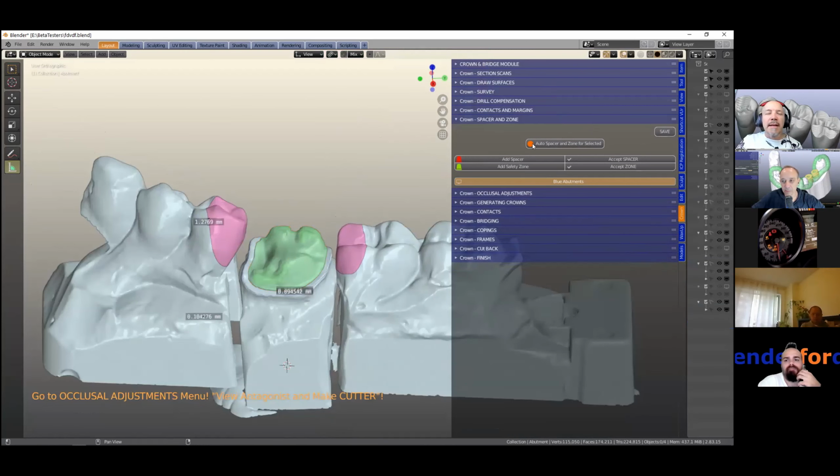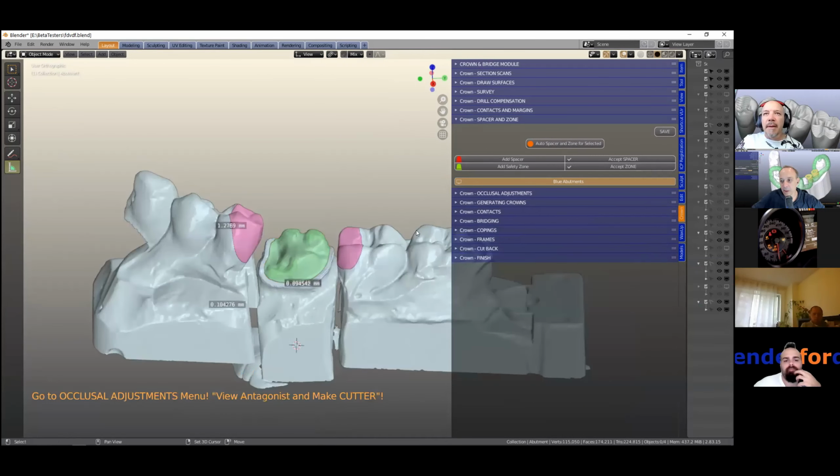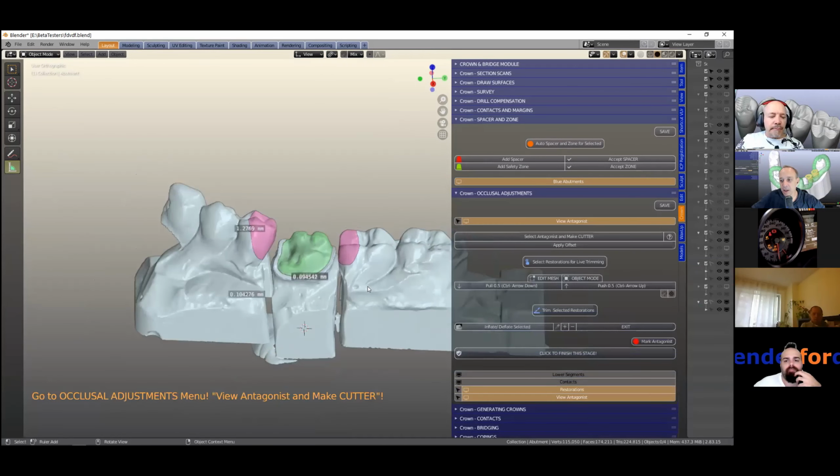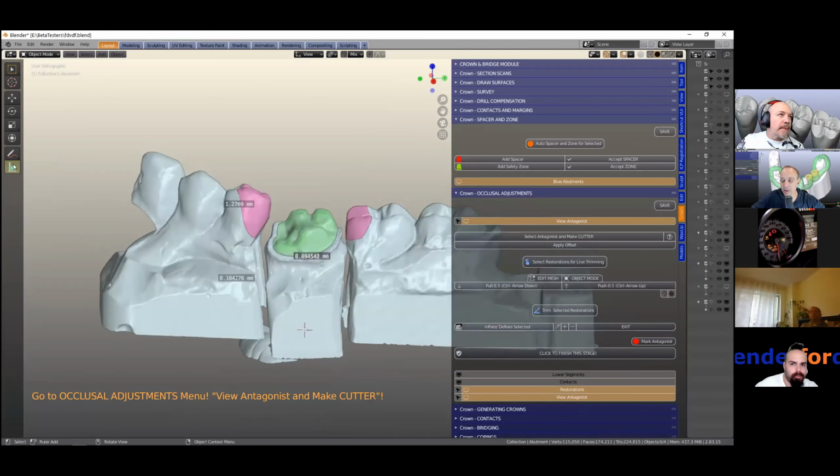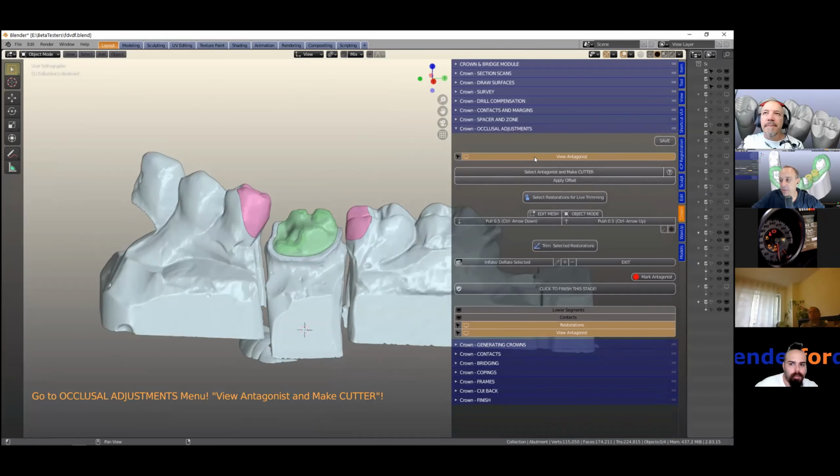The auto does that all automatically, so you can change that on the slider from 0.5 to any thickness you like, just to prevent you milling through the crown in a different material. Definitely. For example, you might want to have it thicker, especially for the molar area.